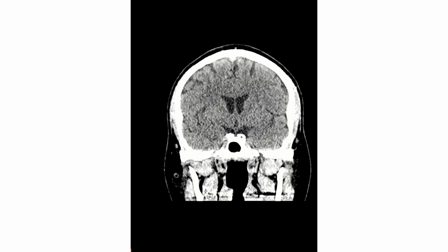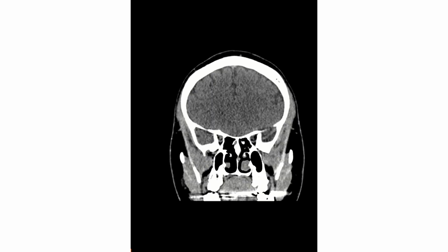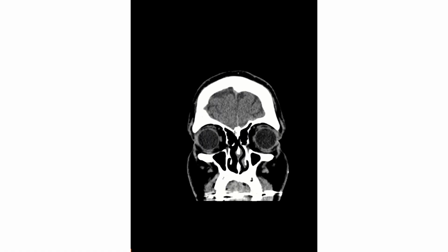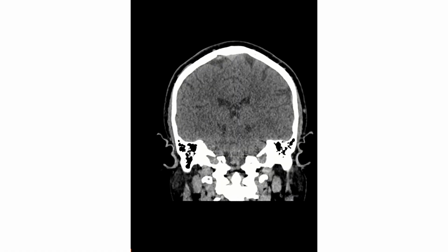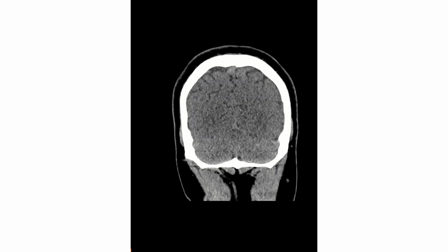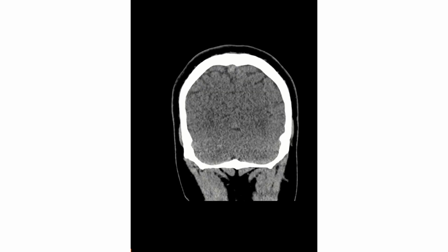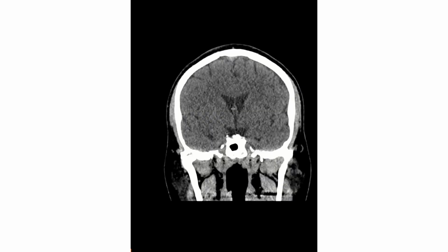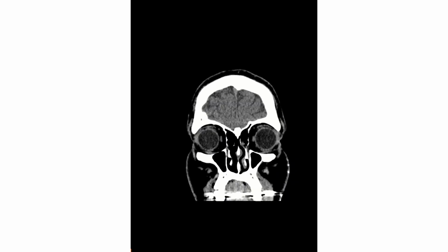And then finally, I quickly look at this. The important thing about the coronal views, I would like you guys to always look at the dura on your coronal views, because this is the area that if you don't see it on axial, you're going to pick up the hemorrhage on this. You see anterior and posterior, always follow it correctly. And then on your tentorium, make sure that there is no hemorrhage, there is no subdural. And then I look at these again, convexities, ventricles, and at the end I look at my optic nerves here.